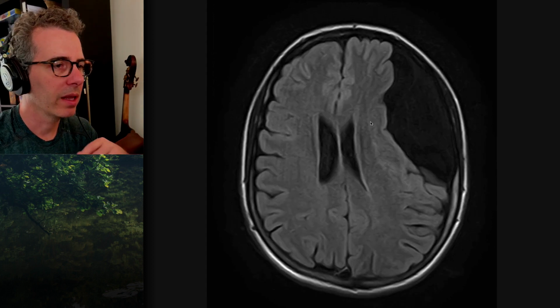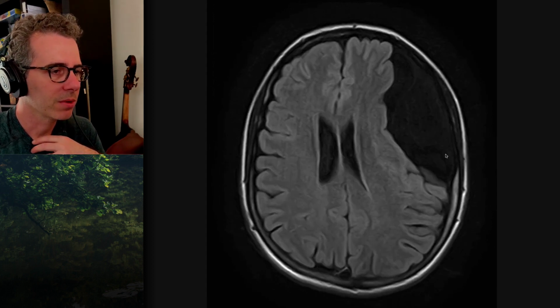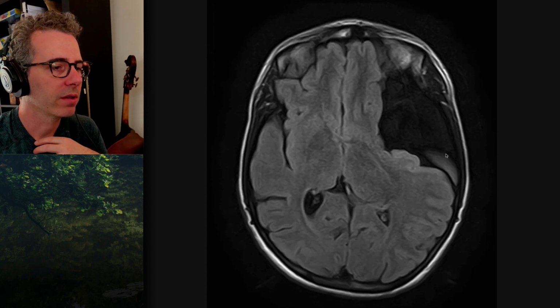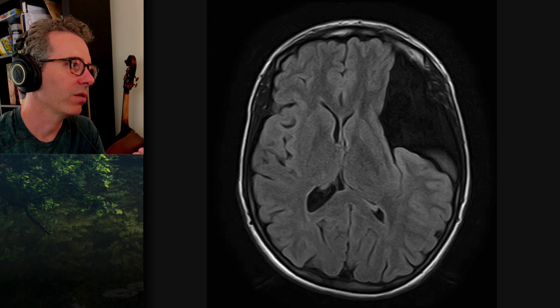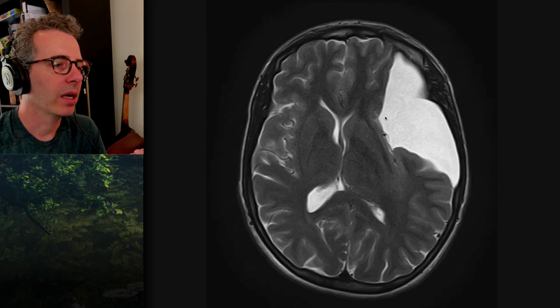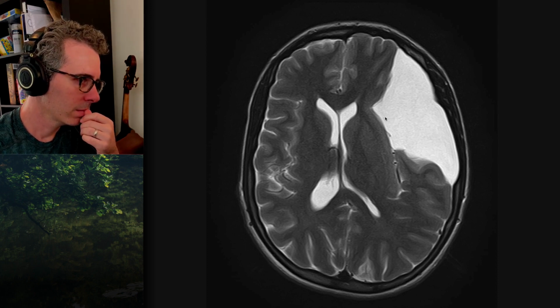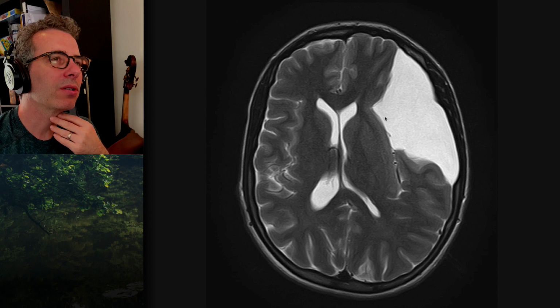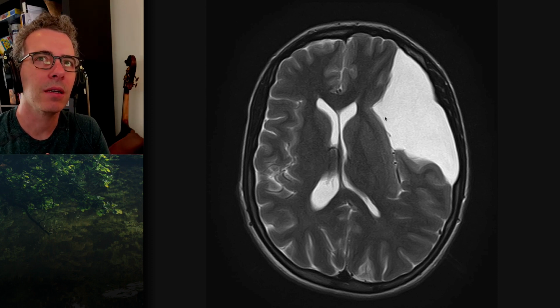They can be remarkably large, and scalloping of the overlying bone is a pretty typical feature. What would the differential be for this lesion? There isn't one, really. But when you first glance at it, what other entities might you consider? An epidermoid cyst? Yep. So epidermoid is largely a differential on CT or on circa 1991 MRI scanners.